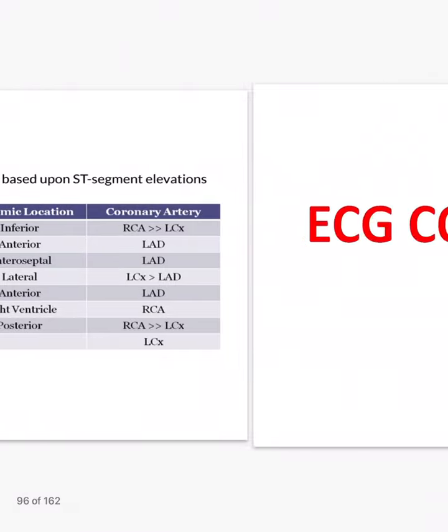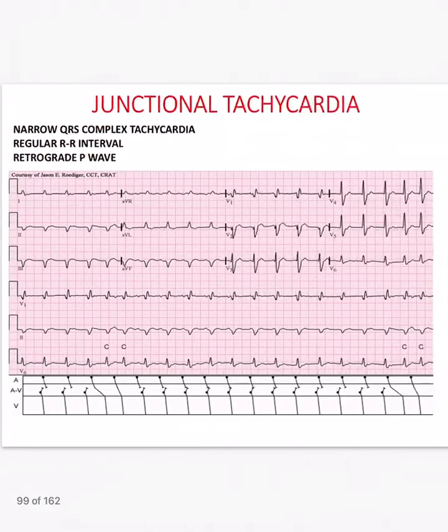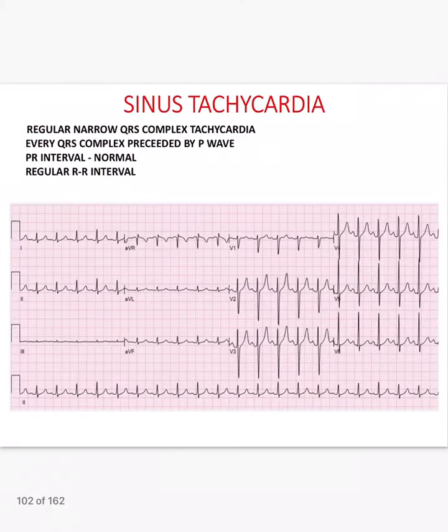Now coming here to the MI. This already we have discussed. Now practicing some of the important ECGs. When I send the PDF on the group, you will find more ECGs. But here we will do the most important ECGs.